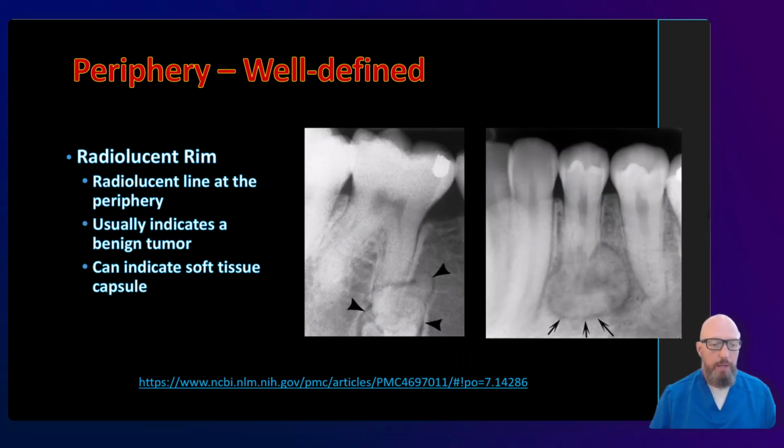All right, what about when a lesion has a radiolucent rim? Usually we use that with a more radiopaque lesion. And so you can see this nice, well-defined, thin radiolucent rim. In this case, you can see a little bit thicker, varying thickness of radiolucent rim. And that's a very specific descriptor. And so there's a paper that identifies 8 different lesions that present with a radiolucent rim.